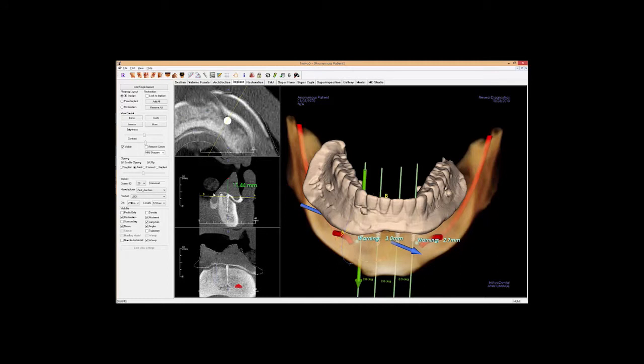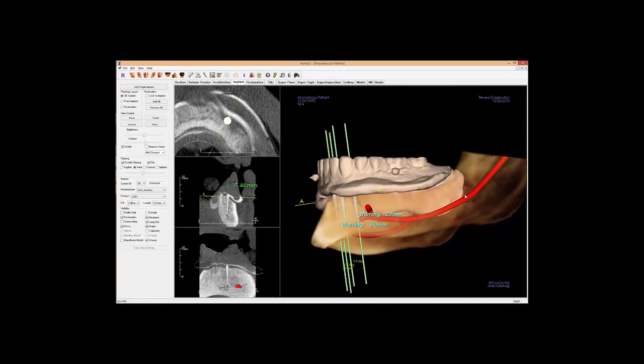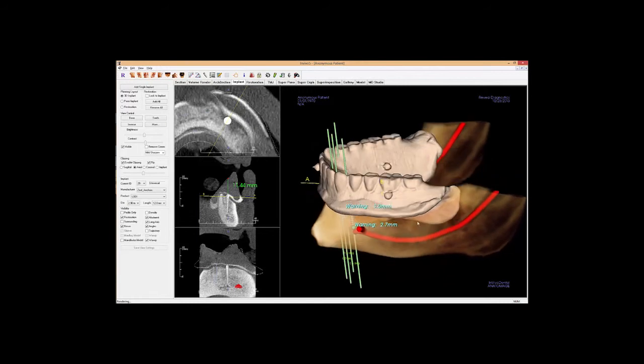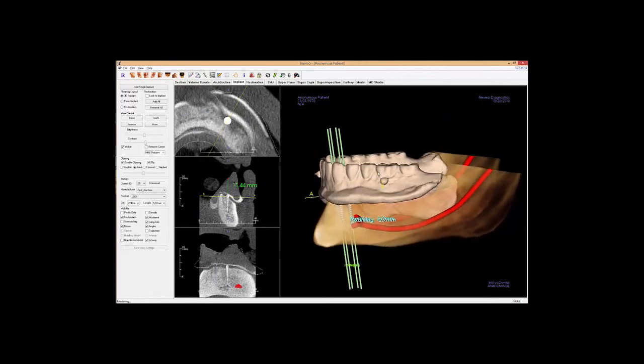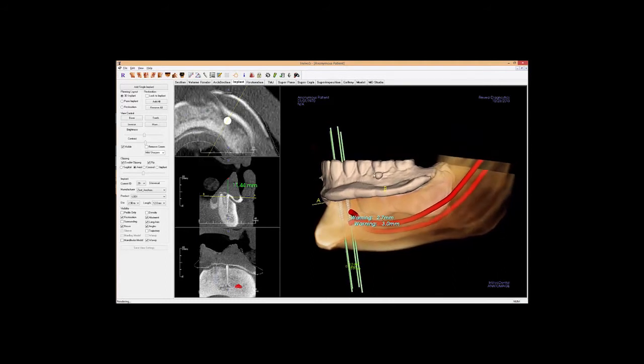Now you'll notice all of that we could have done without this additional wax-up model. And what does the wax-up model give us? It helps a lot as well looking at the angulation of the implant with respect to the denture prosthetics. So ideally we want to see where the access will be, and also are these implants going to be perpendicular to the occlusal plane?